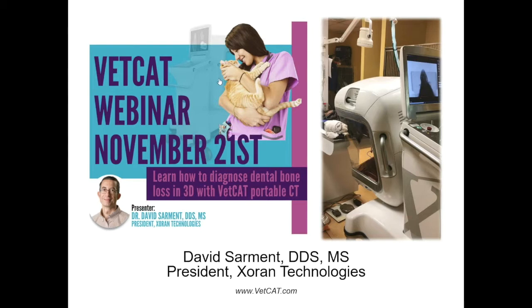I'd like to address today how to read dental bone loss when you obtain a CT scan using VetCAT on your patients. And we'll sort of go over some basics first, and then quickly take a look at a few cases together.